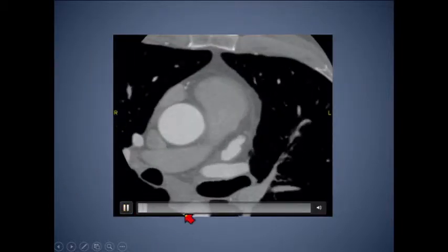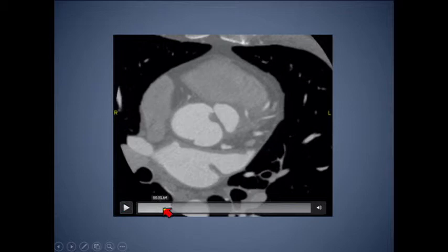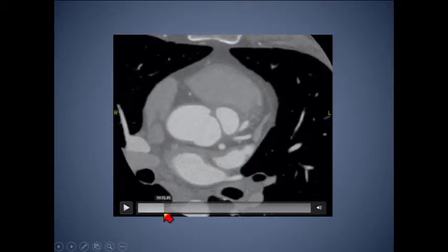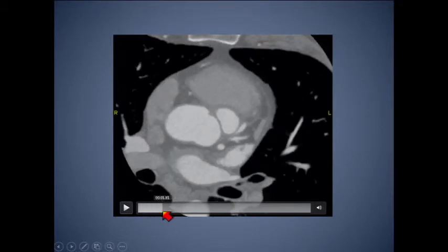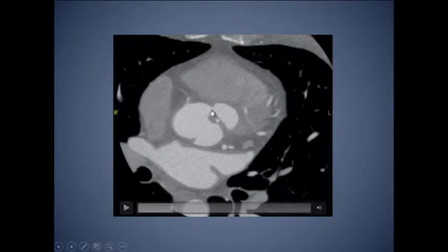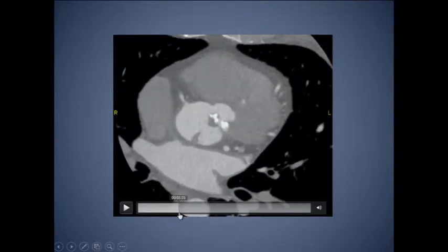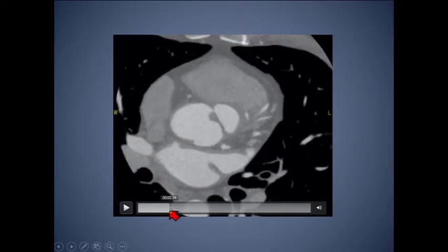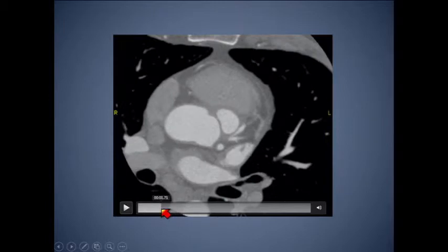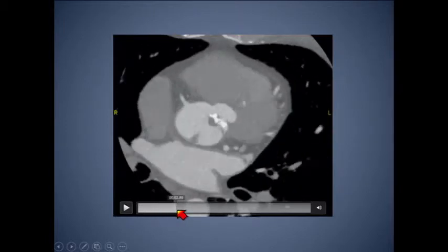So his CT, I'm so happy it worked. On his CT, we did a much better job quality-wise for his coronary CT. And I know Travis showed you some similar cases, but the first thing we see on him is this very large pseudoaneurysm that extended from what was a right cusp all the way over to almost the LAD. It is actually causing some mild mass effect on the region.